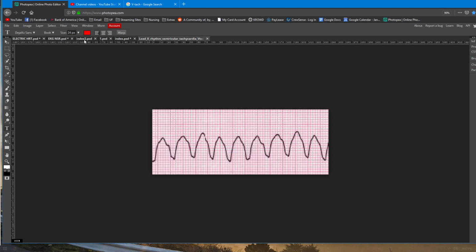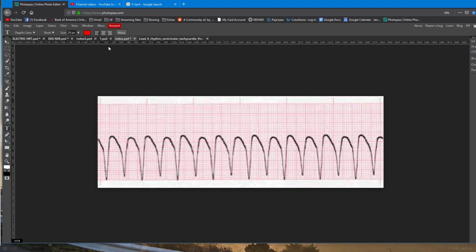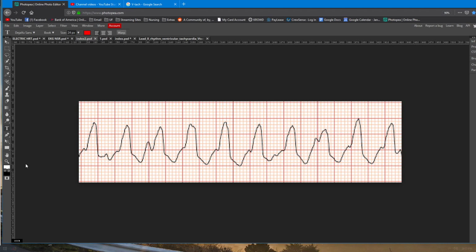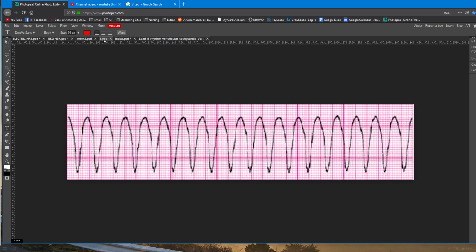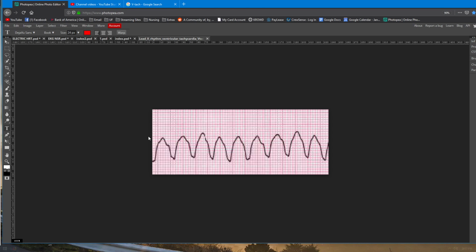Patients who are unconscious and pulseless often get mistaken for asystole. In the movies and stuff like that, they shock asystole, which is stupid. This right here is a ventricular tachycardia. Now, ventricular tachycardia can look a lot different based on what you're looking at, okay?